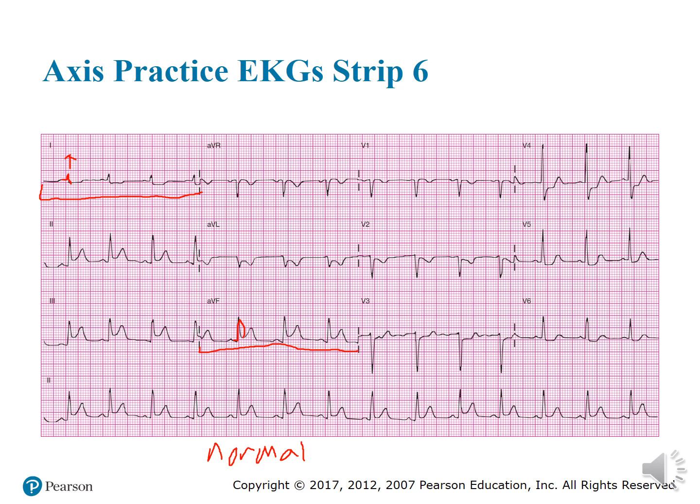So if we're looking at a whole 12-lead EKG strip, all we really have to worry about is lead 1 and AVF. And lead 1, like I said, starts from the beginning of the 12-lead strip all the way to the hash. So that's the whole reading of lead 1. Same thing with AVF. We go from hash to hash. This is all the AVF reading.